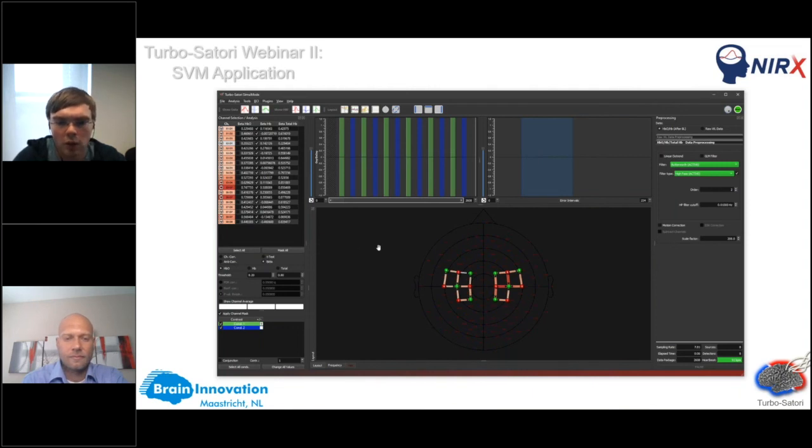So we estimate the AR values, and then we rerun the whole GLM, which is done in parallel to the whole calculations that you see otherwise, so that you can ensure that the whole processing is done in real time and the t-statistics is done online, so as soon as the calculations are done. But there's just the default real-time estimates.